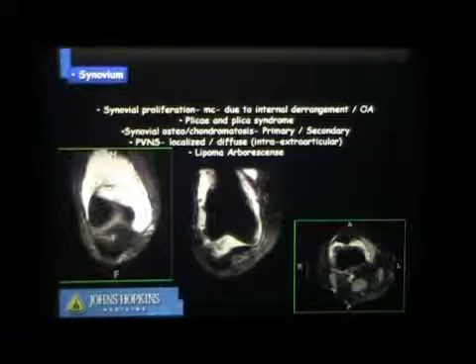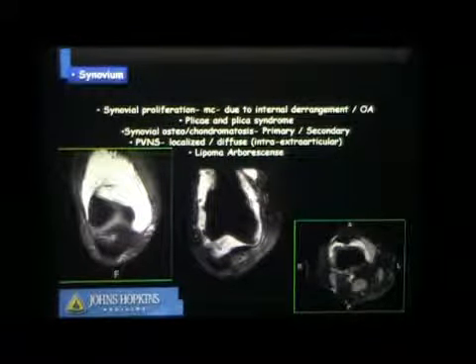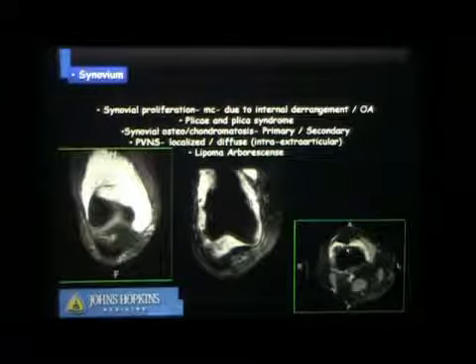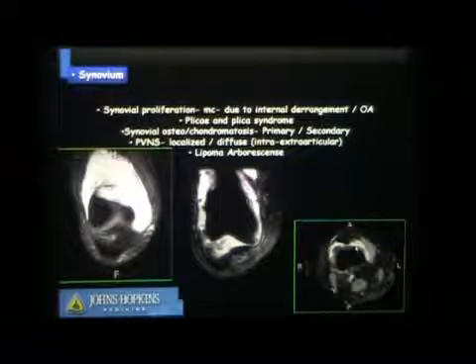Now this synovial proliferation over time can become fatty also. Okay, you can have fibrofatty proliferation. And some people name it lipoma arborescens, which can be partial or complete, but it means the same thing. It's a synovial proliferation, it's a fat proliferation. So if you see that in a kid, where this is the only isolated abnormality, then I use the term lipoma arborescens, where I have to go in and do synovectomy. In adults, when they get this much derangement, everybody has some portions of fat which are proliferating out. This is all fat which has proliferated. So secondary lipoma arborescens, if you would say that, that's pretty common.